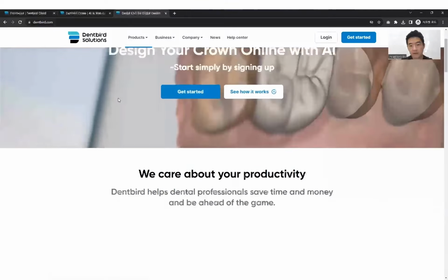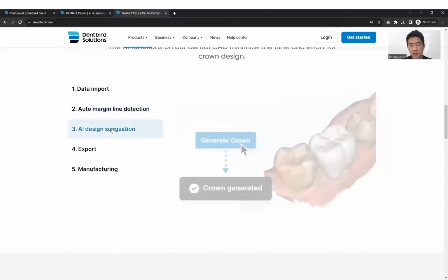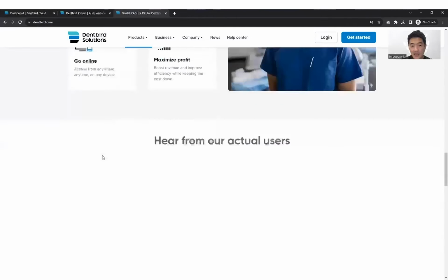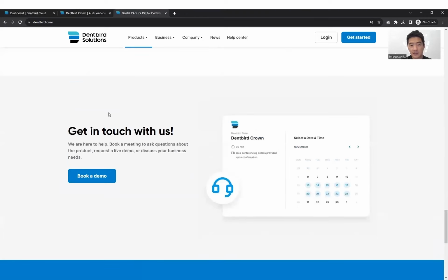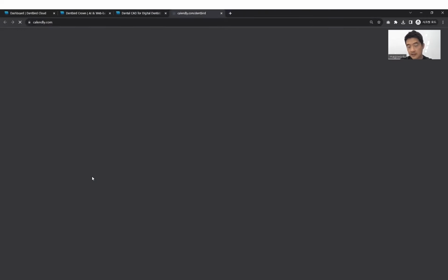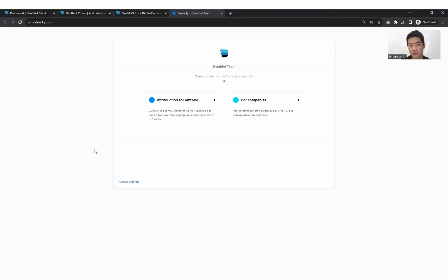So here, if you just scroll down, there are some new functions and automation that we have made, and some testimonials. Here, there is a get in touch with us. So you can book a demo here. If you click in, you can determine whether it's going to be an introduction, a requested demonstration, or, if you are a person from a company, we can discuss collaboration using this function.